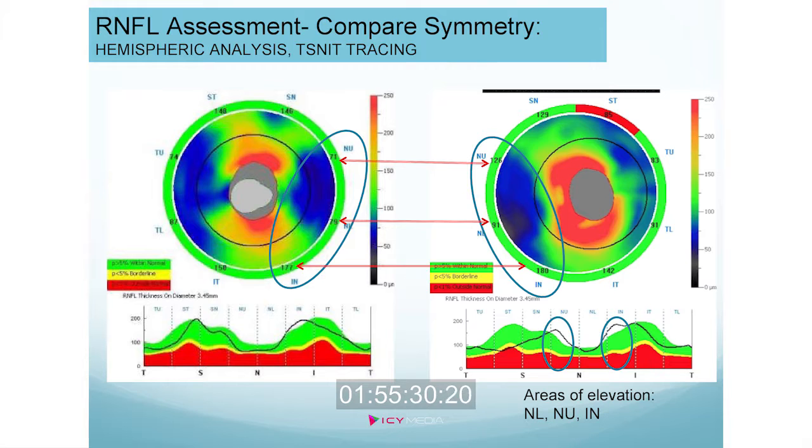That's where you see all the different colorations. Blue meaning flatter tissue, red meaning more elevated tissue. It's normal, superior and inferior, to have red in the peripapillary space because that's the thickest tissue. So we would expect those two wedges, if you look at the right eye, that's what normal looks like. You can expect that red, superior and inferior.